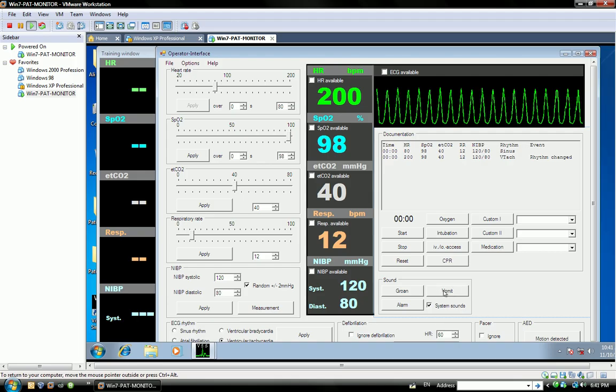If the patient is vomiting, for example the mannequin, but also keep in mind please that the mannequin is not vomiting. It is only the mannequin's simulation. Please remember that. Groan, vomit, these are all simulator functions, and these are only represented to show a patient's critical condition.